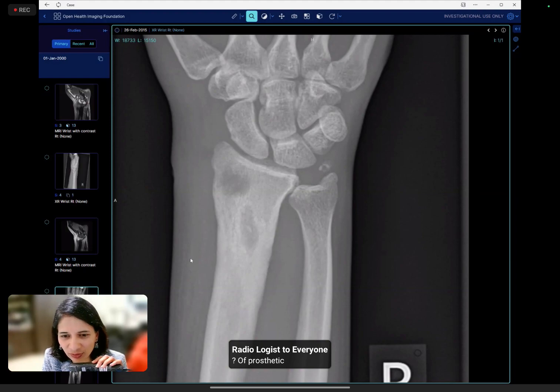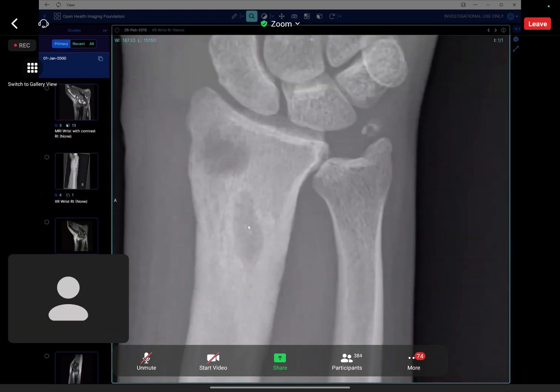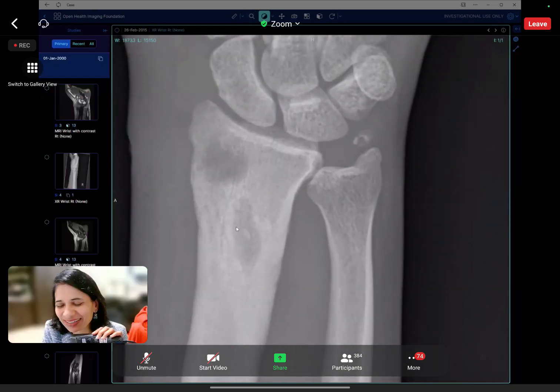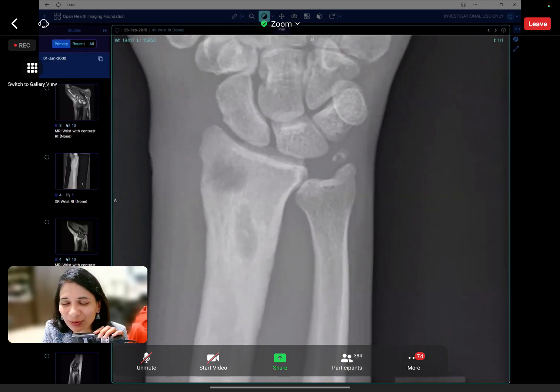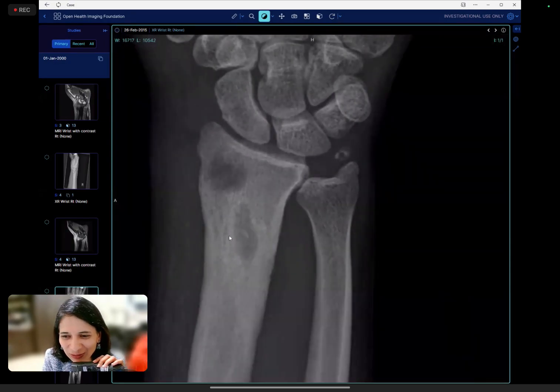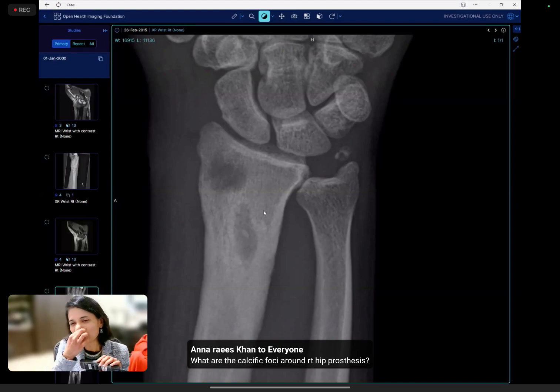Yeah, that's because of all that inflammation that you have, and then that's your sequestrum, isn't it? The dead bone. Yeah. Actually, I could see it in MR. I didn't pick it up here. Yeah, because I think actually it's more difficult to spot on the MR because of the resolution. Whereas here I was trying to show you, but again when you said, oh, I will consider osteomyelitis, that's what you're looking for, and that's what is there. So all features of osteomyelitis actually are seen here.